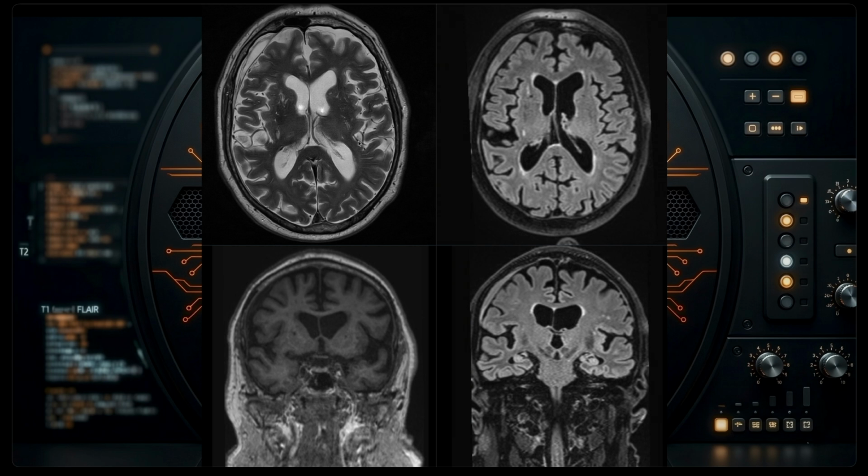And finally, how does it look on FLAIR sequences? You can see the protein-rich fluid in the chronic subdural hematoma is showing high signal on FLAIR sequences. So this is quite characteristic, and you can appreciate here this is the subarachnoidal space that is compressed. Same in here, while here the subdural space is expanded.